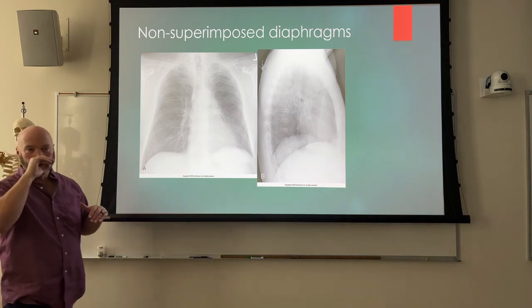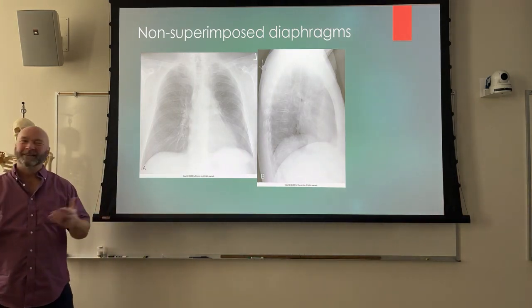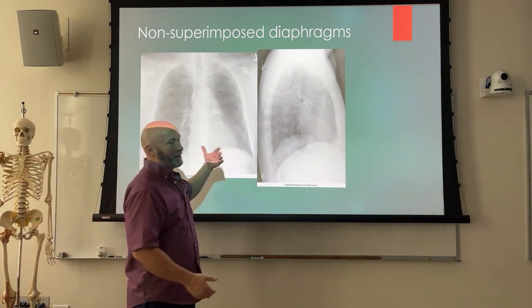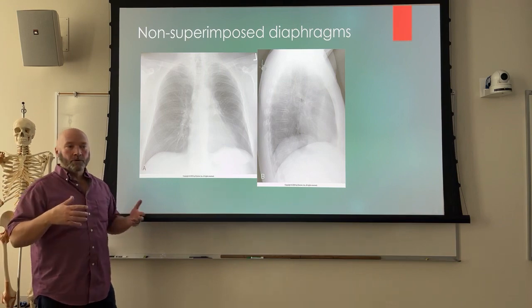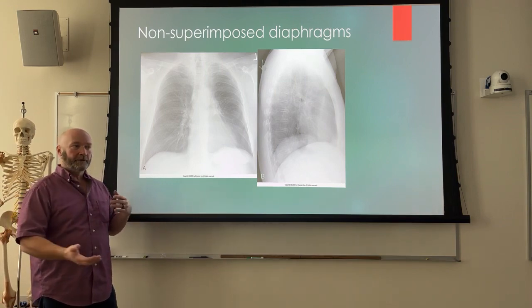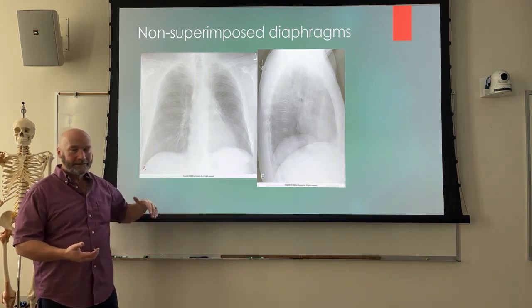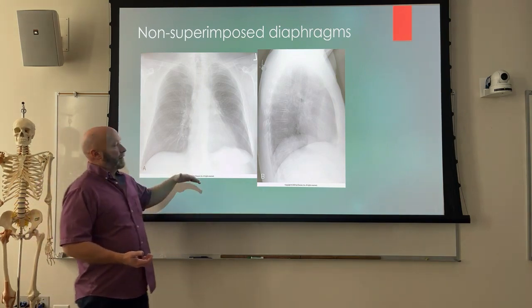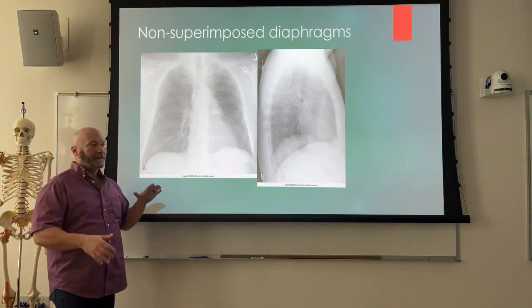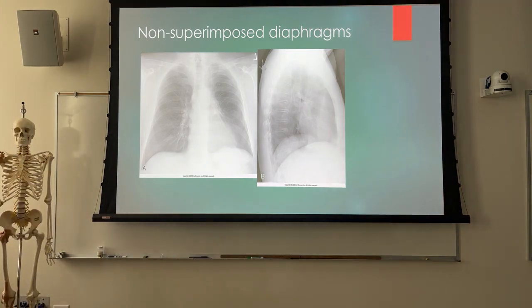Close. Obstruction? Well, really one thing, obstruction. Well, no, two things. Obstruction could be because of aspiration, right? Or post-surgery. If there's some sort of irritation of the phrenic nerve that controls that side, you may have a frozen diaphragm. So look at your PA before you absolutely assess whether or not the patient's tilted. In this case, this is just patient's anatomy.